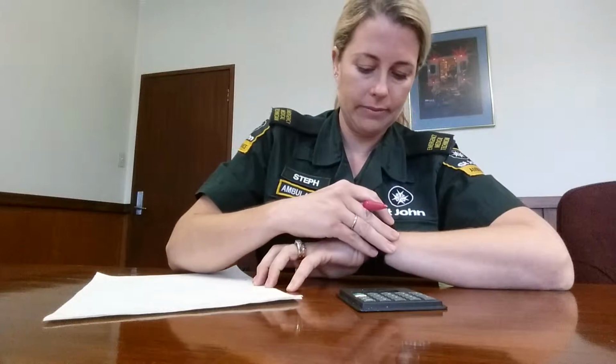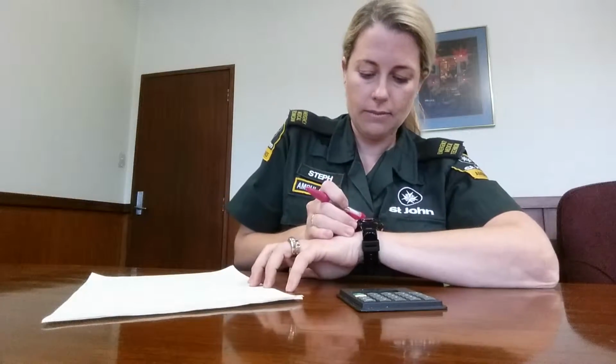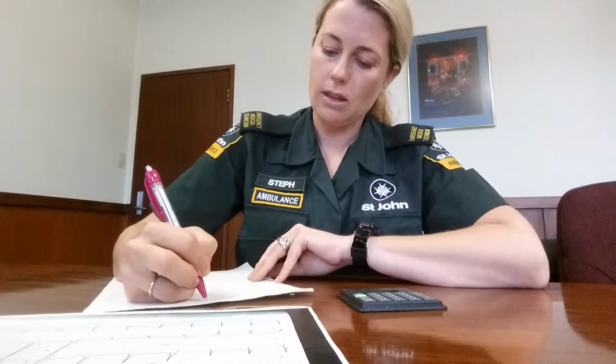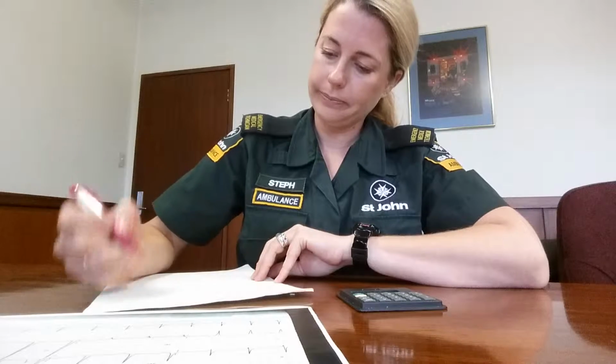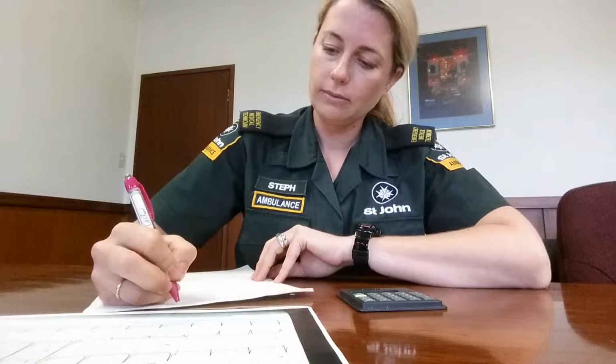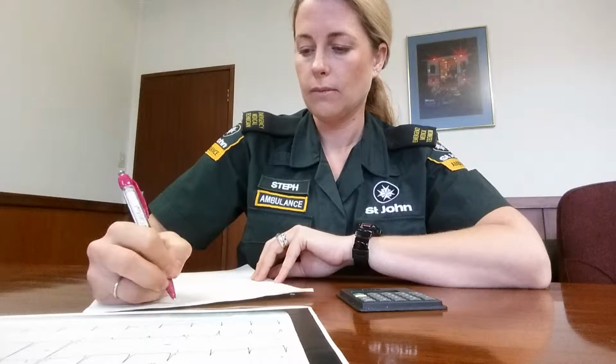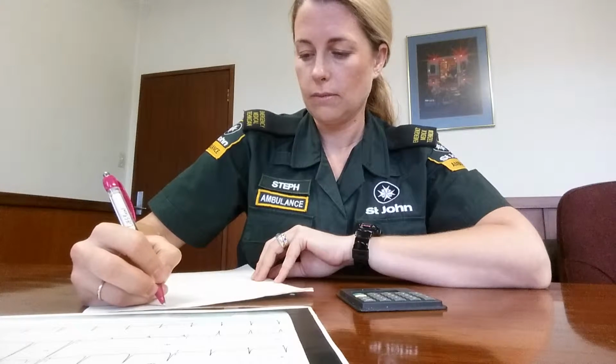Okay, I'm going to give you one of the ECGs and if you could read out which number it is. Number 3. Right, I'm going to give you a brief history of it and you can ask again if you need to know more about it. So you have a 23-year-old female who has described her heart as racing with shortness of breath.